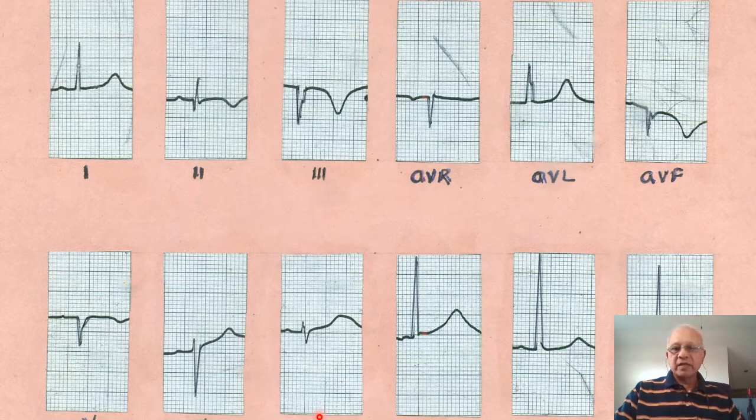So you can start off answering this question. I'll give you a couple of minutes for this, and hopefully you'll be able to pick up the diagnosis, which is very easy in this case.